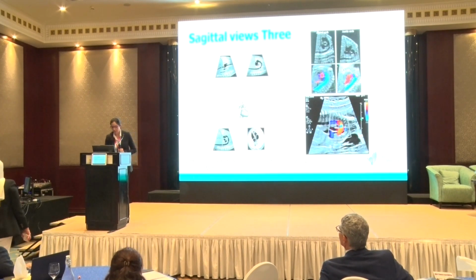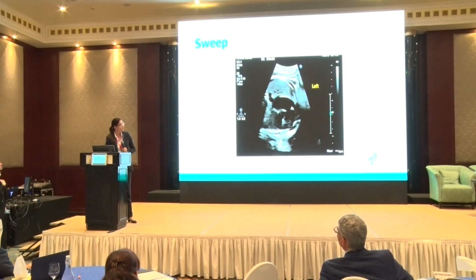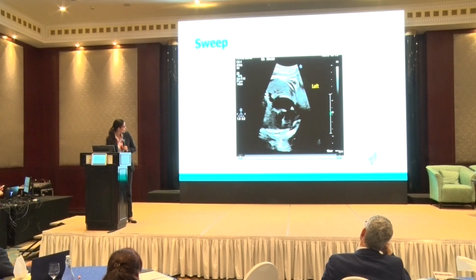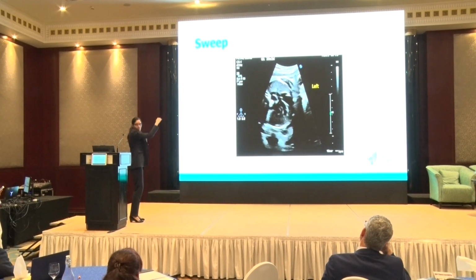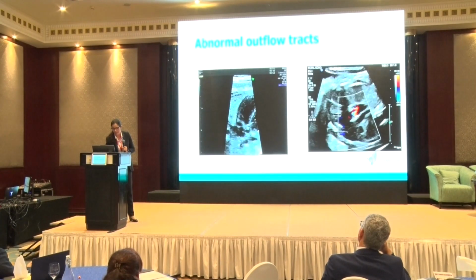That one, I had to use it also for my talk, so it has left isomerism. Let me go back. In this one, the azygos is behind, similar to the one you showed. The azygos is behind the aorta. Here I don't have it, but the vessel, there is the aorta, and the one behind is the azygos. I know this because I used it when I was explaining the left isomerism.